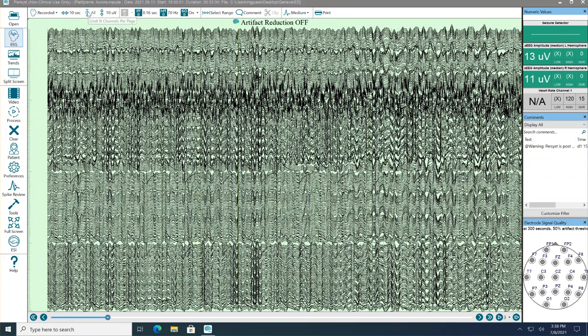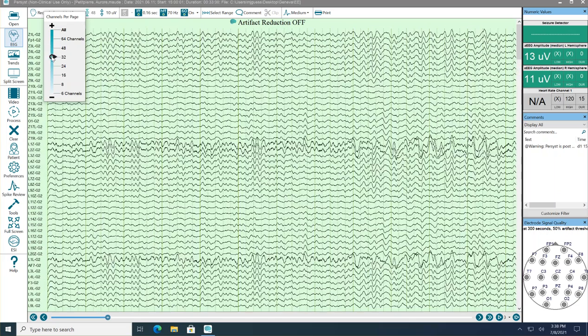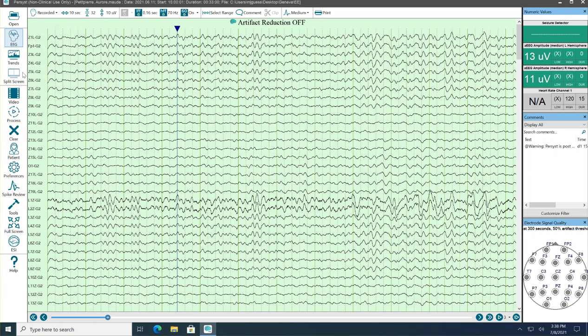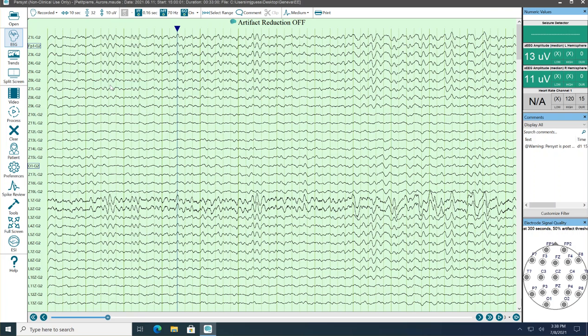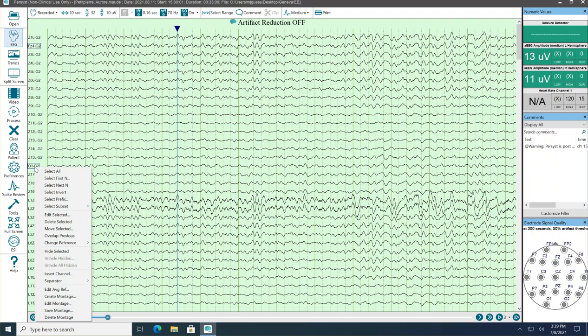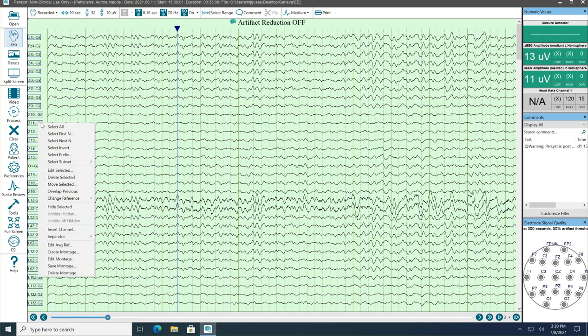We'll go back to recorded, and I'm going to go to the channels per page, drop this down a bit, and I'll go to 32 just so it shows up better in the video. Now I'm going to right click on one of these, and one of the menus I have is to select a subset. I'm going to select 1020. That actually selects all 1010 and 1020 channels. And so it's put a box around these and left the other ones unselected. I can right click and select invert so that all the channels that aren't 1010 or 1020 are boxed. And I'm going to right click on one of the boxed ones and delete selected.